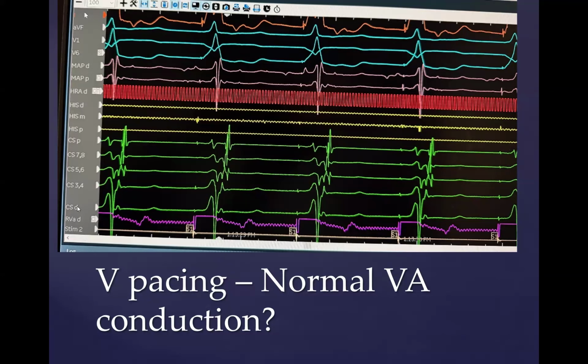right? CS distal is where relative to the mitral annulus? It is the most distal from the mitral annulus. Right. So would that be medial or lateral mitral annulus? Medial. No, lateral, right?